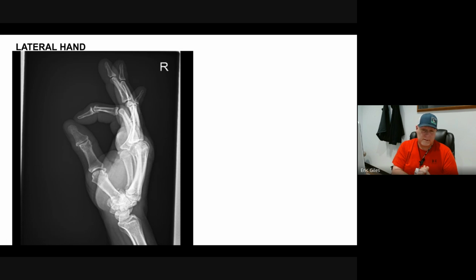over each other. This is what x-ray is about, taking a picture, looking at that x-ray and figuring out what you need to do different. If it needs to be retaken, which I would not retake this, at least you know what direction you need to take to fix the problem with that image. Now, the next time I take this hand, I'm going to pay close attention to spreading the fingers out and seeing those distal phalanges. It's all about learning.